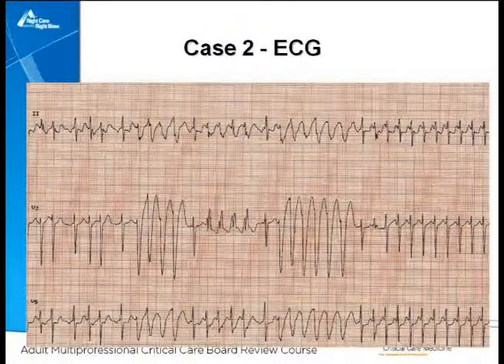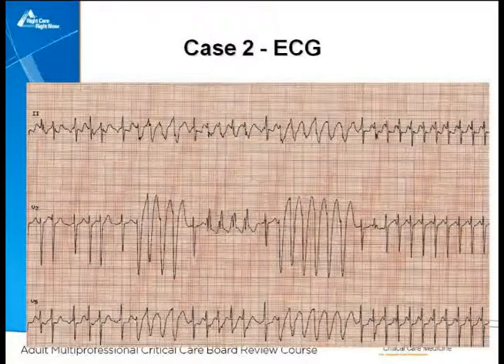And again, we have to let people look at the tracing for about 30 seconds. Okay, now we can start the timer. Put your answers in.